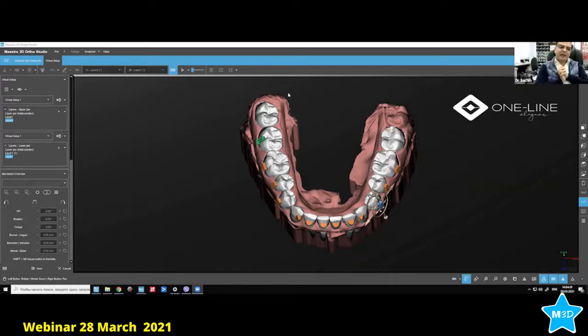Per se, we can say like this. The velocity per aligner for translation is 0.2 if you're using multiple layer sheet. Rotation 2.5 to 3 for multiple layer sheets. For single layer sheets, I would use maybe 1.5 to 2 degrees, not more than that, never, because it's not going to work. And then the size of the teeth, please. The bigger the teeth, the better it is for you. With smaller teeth, you have to go slow.